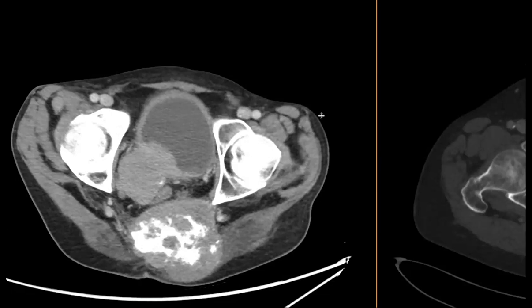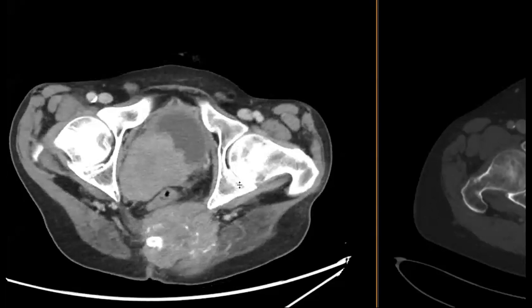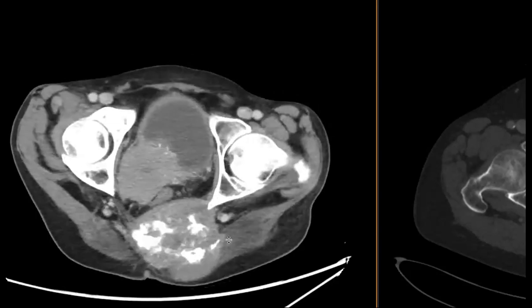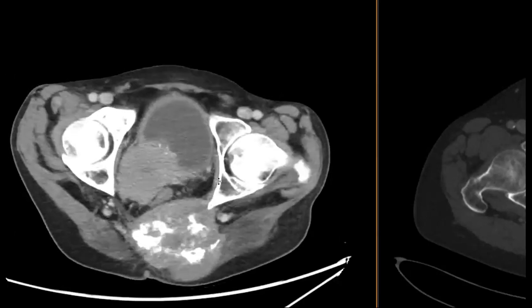Yes, absolutely right, Nelly. That's the second point I was going to bring up, that because of that, the PSA is not a good biomarker. It doesn't rise in these patients. And so CT or MR or whatever way we are following them is the way to suspect that this might be the case, if the mets increase in size or the mass increases in size. Unfortunately, these can be very aggressive, as you can see here. So let me stop sharing.